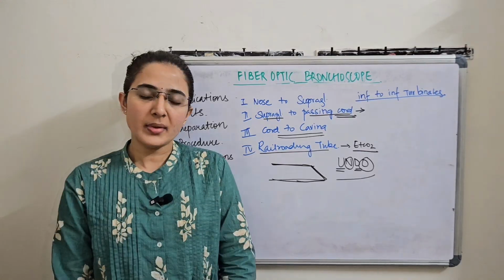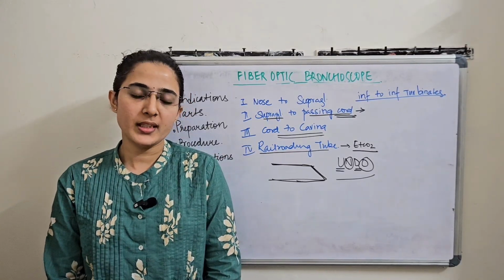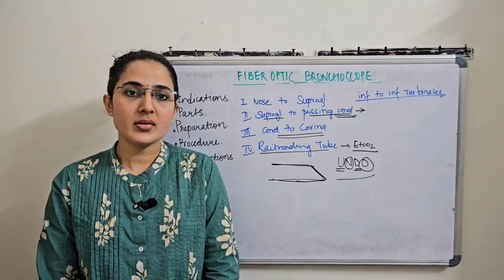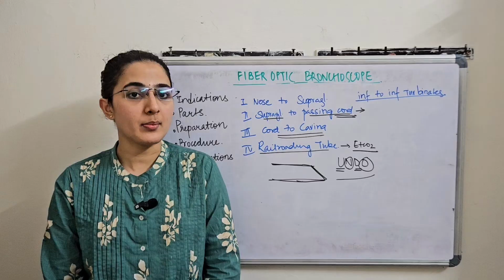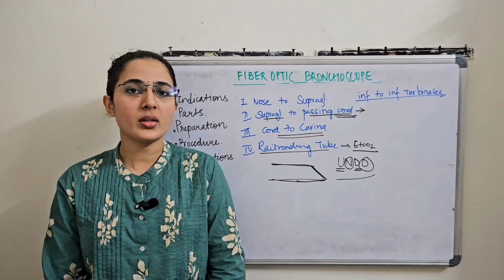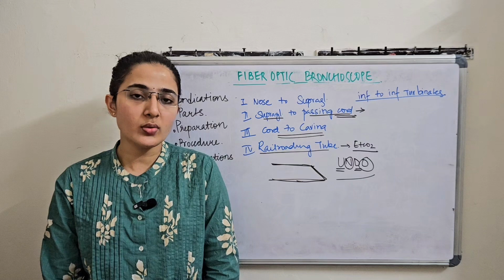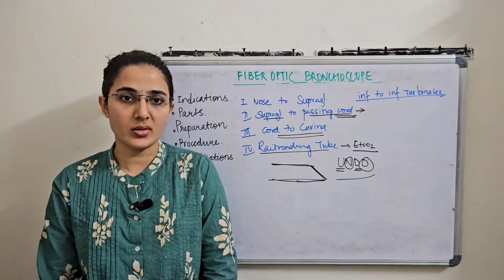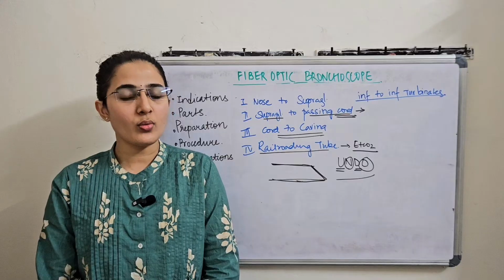So coming to the end of this video, the fiber optic bronchoscope is a very important device we have to know, and the process of doing a fiber optic bronchoscopy has its own learning curve. It's very important we understand what the views are, and proper preparation of the patient also helps a lot during this process.